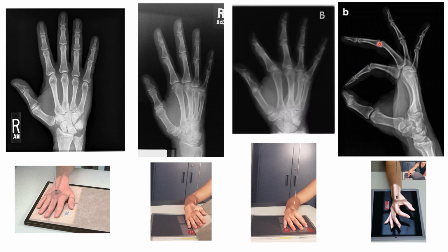But we do see beautiful open joint spaces here, identifying to us that the patient's hand was parallel to the IR, and we used the proper perpendicular central ray placement. Rotation-wise, we can tell that it is a true lateral because of the superimposition of the metacarpals and of the radius and the ulna.